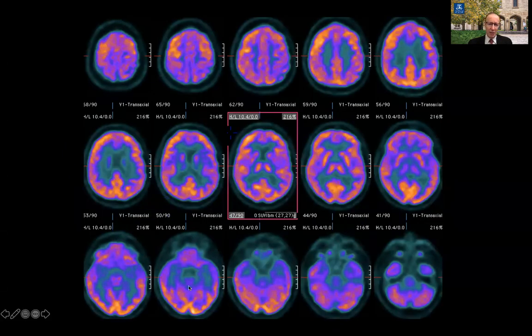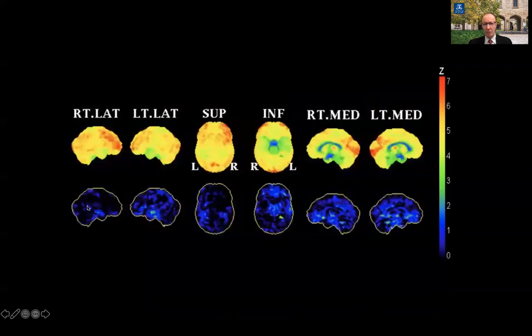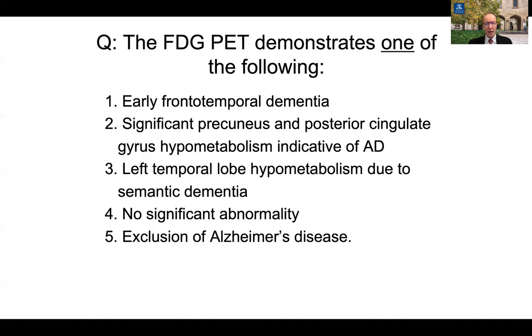And when I look at these medial temporal lobes, I am concerned, particularly here on the left, when you see this sort of little thin ribbon, it usually means there's a bit of temporal lobe atrophy and hypometabolism, although it wasn't reported as such on MRI in this case. So just a few little features.